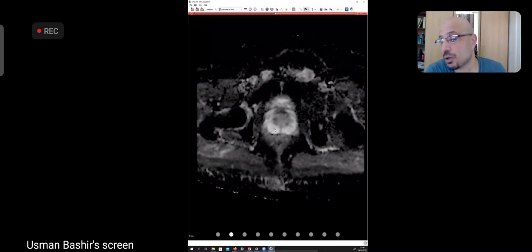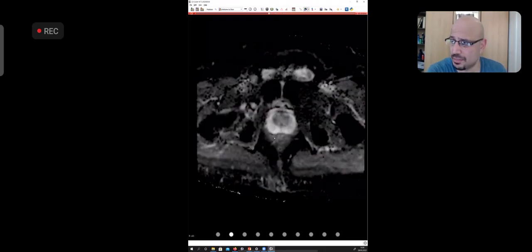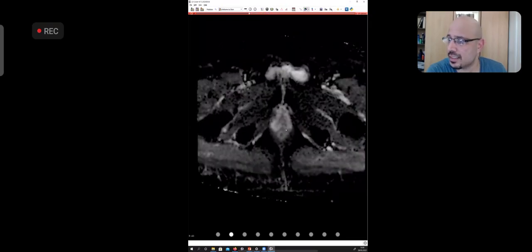Okay, that is a level of variability even experienced radiologists will experience. If I'm calling this PI-RADS 4 and a colleague, even my trainee, is calling it PI-RADS 3, I would not criticize. Likewise, this one is dark. If they call it 3, I will say okay, well if you say so, but I think that's PI-RADS 4, so that's fairly dark.